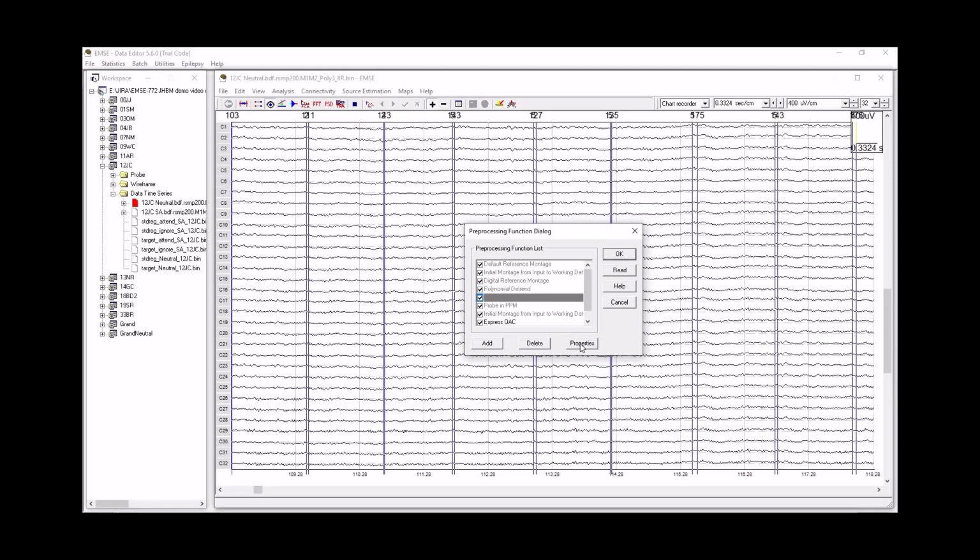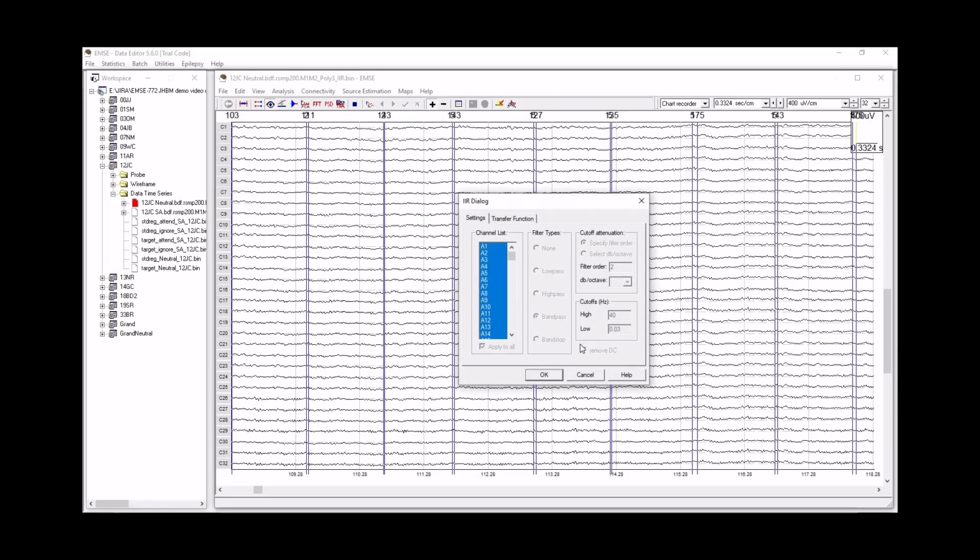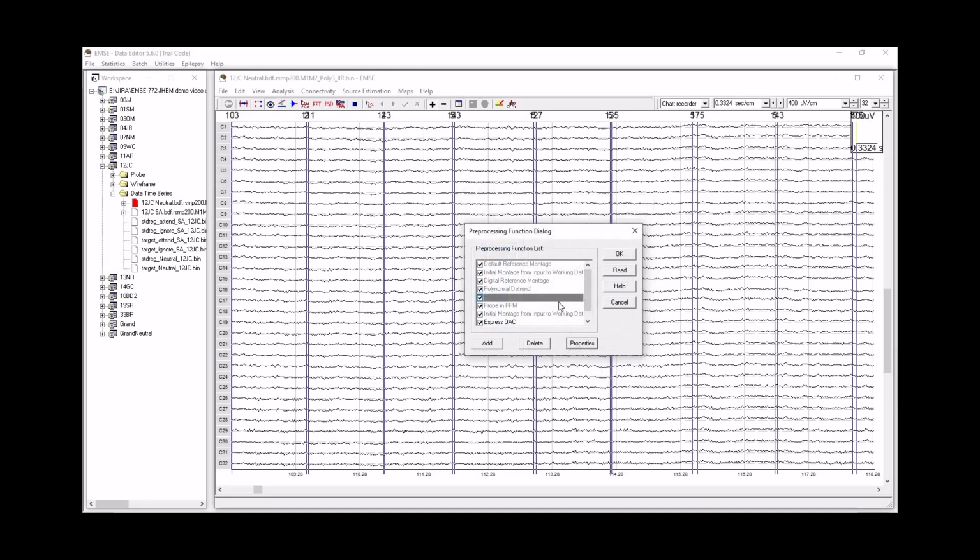And we did a Butterworth IIR filter from 0.03 to 40 Hertz, filter order 2, and importantly, this filter has already been applied to the whole data set. So that's nice. We don't have to do it. It speeds things up, but it also gets rid of any warm-up artifacts. The warm-up artifacts are at the end of the data.